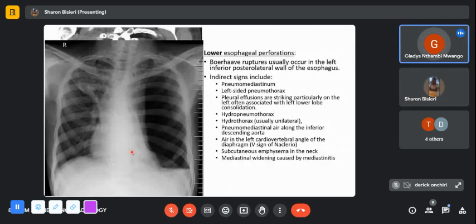Can we still comment on that despite having this amount of rotation? I personally would still think about this mediastinal shift and need to figure out why, because I'd rather talk about there being mediastinal shift than miss it altogether.